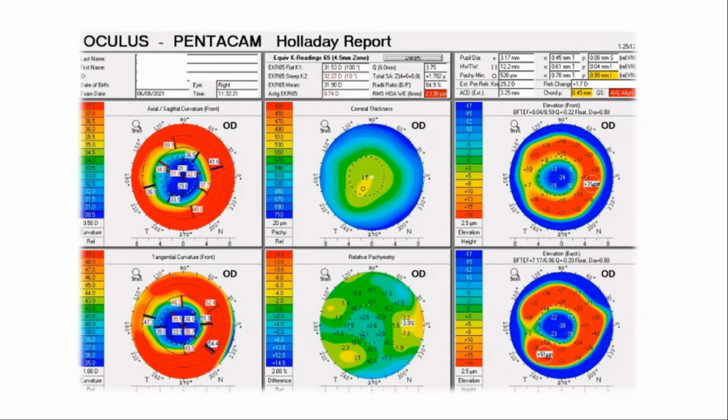You're right. I think it definitely would have a role in keratoconus as well. But anyway, this is some homework for us to look up: in a normal person, in a non-operated, virgin eye, how would you know on this report, on the Holladay report, if a particular cornea had an abnormal posterior keratometry or a normal posterior keratometry, which was within the normative range? I think our time is going to finish in less than a minute.